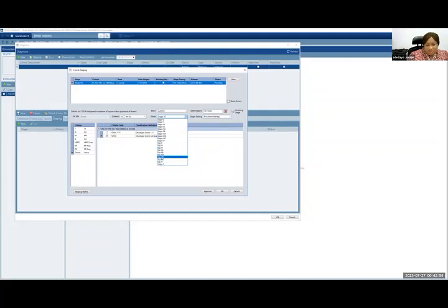Stage 3B, yes. So we have done custom staging because we don't have all the information that we need to be able to fill this part in. And the important thing is that when she does confirm the HER2 status, is to come back up here and do a new staging, rework the staging. And like I said, you would uncheck this, and then that new staging, updated staging will become the working stage, and this will no longer be the working stage.